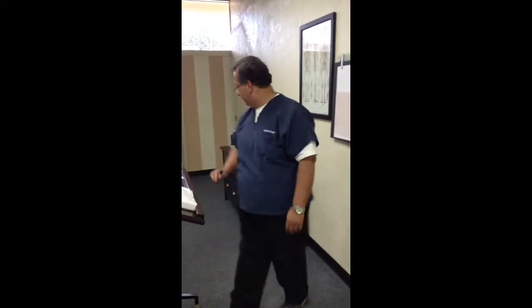In this video I'm going to show you how to measure an EKG, and it's a lot of fun to measure an EKG, but it takes a little practice. And so I'm going to start off by just sort of referring to an EKG. I have an EKG printout right here, an electrocardiogram. And this is what an electrocardiogram looks like. This is what we're going to be measuring.